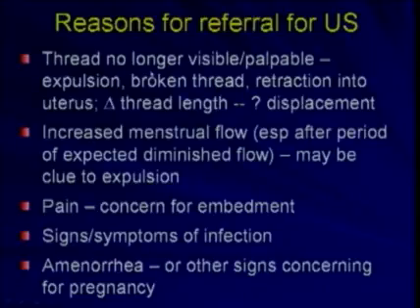Commonly, the thread is no longer visible or palpable, and there is concern about expulsion or a broken thread or retraction into the uterus. Also, there may be a clinically apparent change in the length of the thread, which suggests the possibility that the device has become displaced.